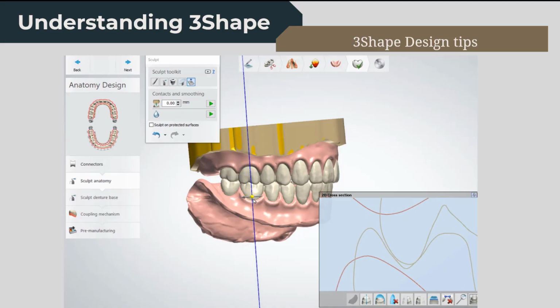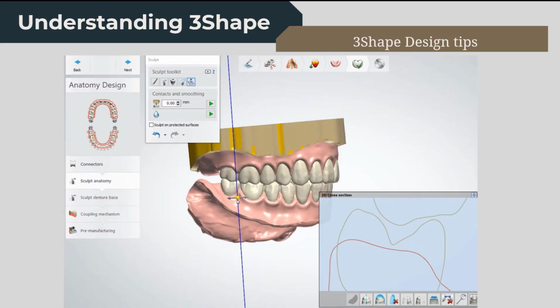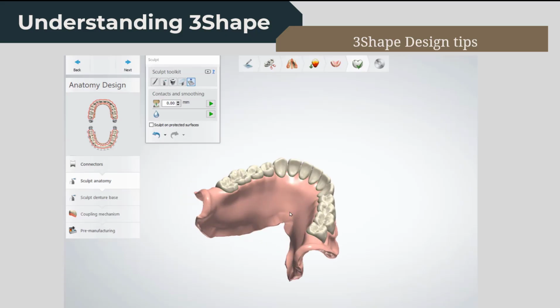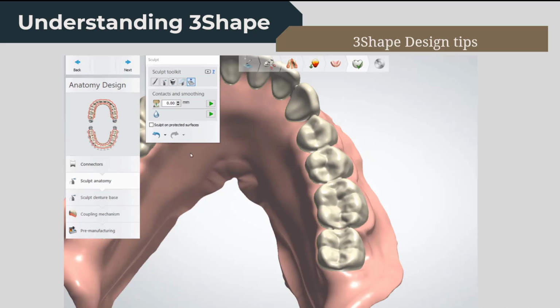It's not a complete chop of the lower, and I'm going to do an occlusal view so you can see the difference. Again, this is a very extreme example to show us what's happening. I would not normally cut this much off, as it would probably lock you into the bite. So if I do an undo and a redo, and you look at that occlusal surface, you can see what it's doing. It's not getting rid of all the anatomy. It's pushing in the opposing contacts.